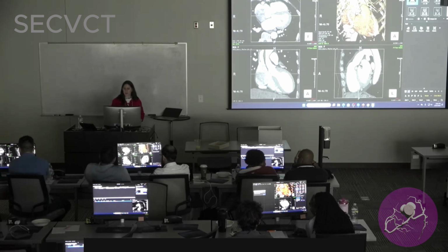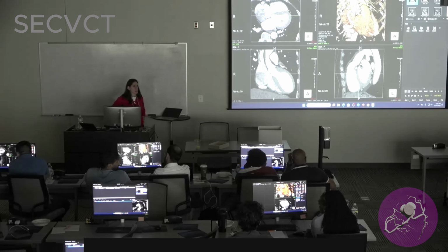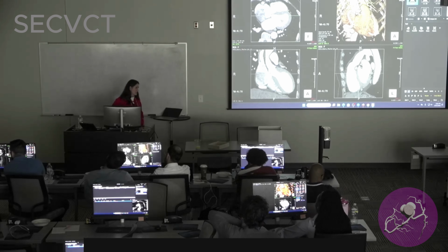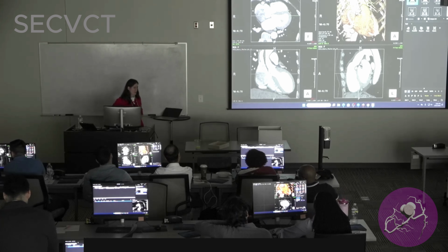Yeah, so you really can't differentiate the two. But if you have a replaced pulmonary valve, I have never seen, I can't think of any times I've ever seen it be thrombus, like truly thrombus, and not superimposed endocarditis with that size of a vegetation on the valve.